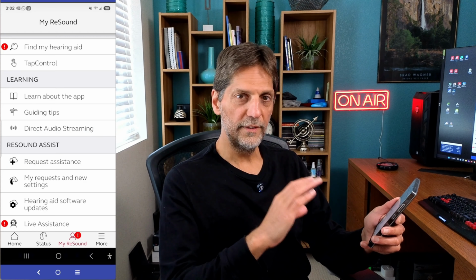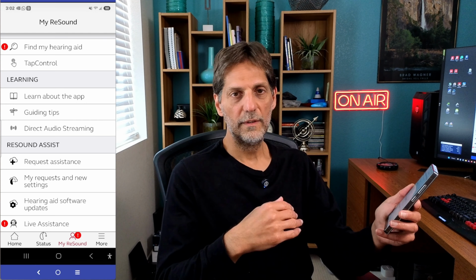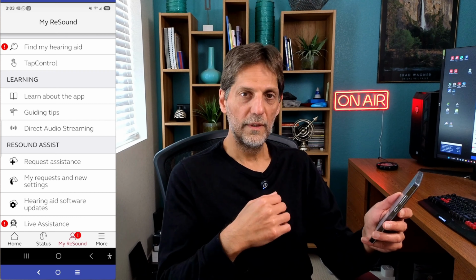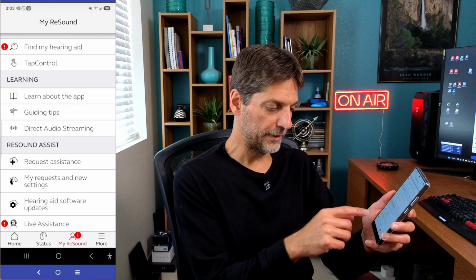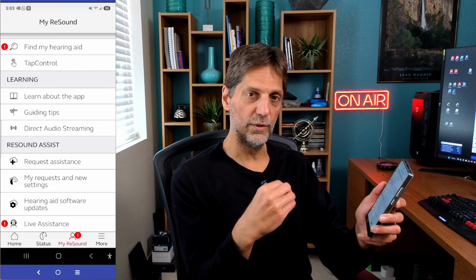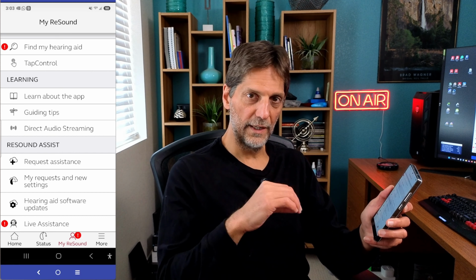The last part here is actually pretty important. This is how you're going to get assistance from your audiologist. So let's say that you've been using the hearing aids for a few days and you have some feedback and you need some changes. You can schedule a time with your audiologist and jump into the live assistance. What that will do, it will start a session between the audiologist and you, and you'll be able to talk with the audiologist and make changes to your settings live at that moment.